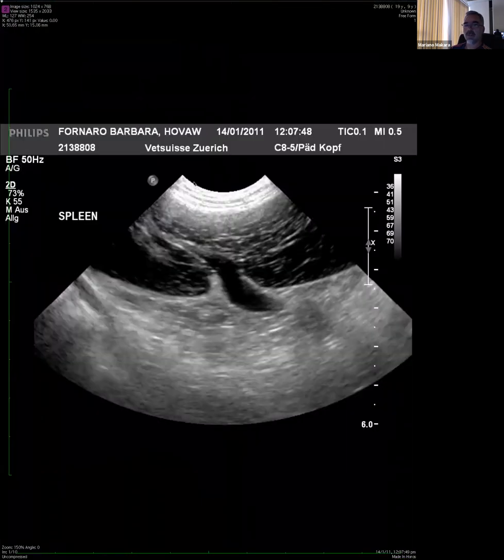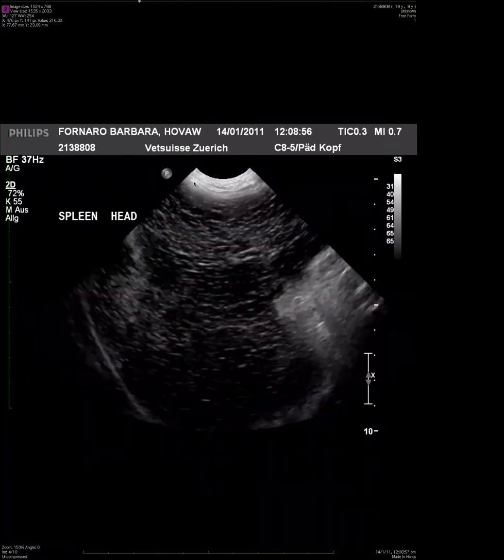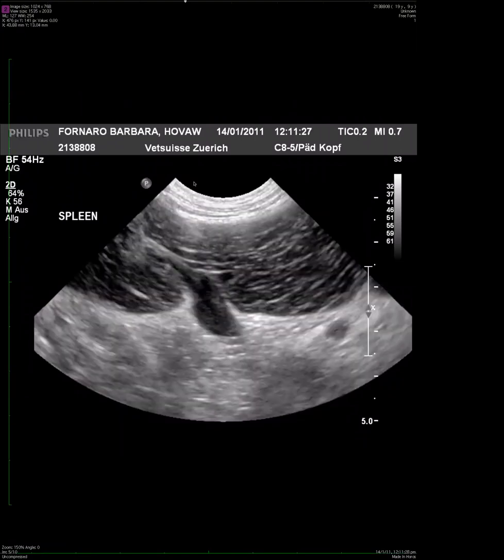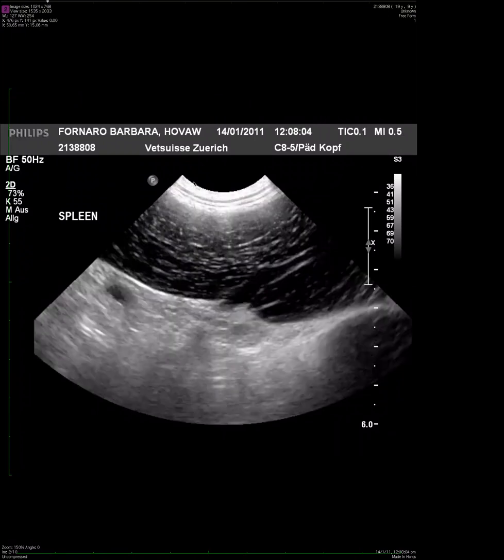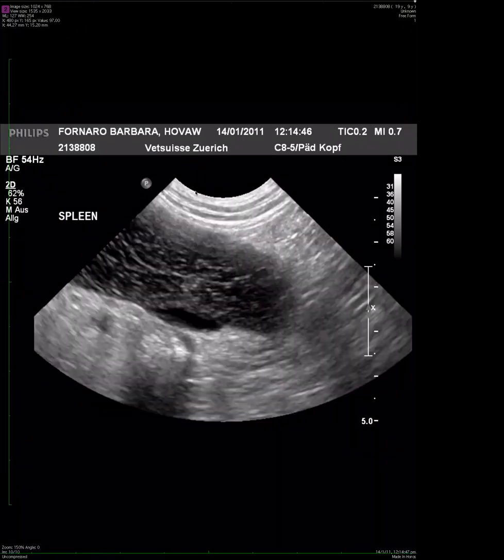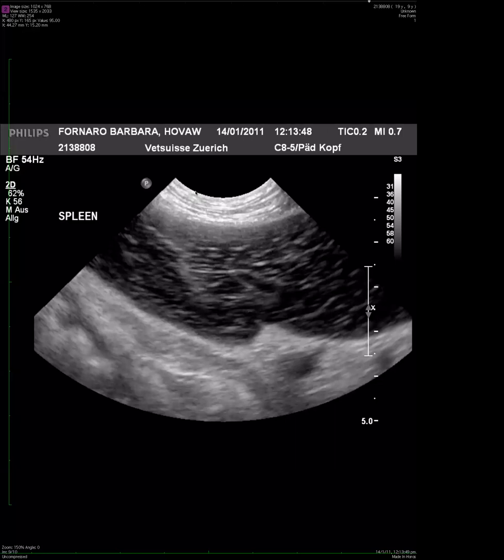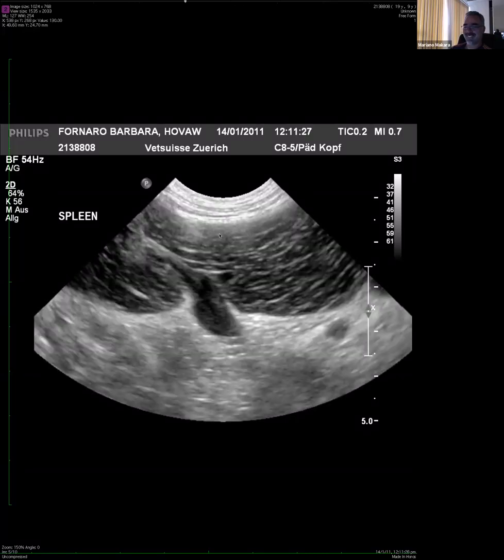Yes. So anyone willing to? I think this is a common image in a splenic torsion. And why? Because I don't know how to say this in English, the hyperechoic lines, like striated. I don't know if this word exists or not. Como estriado. It's the star.